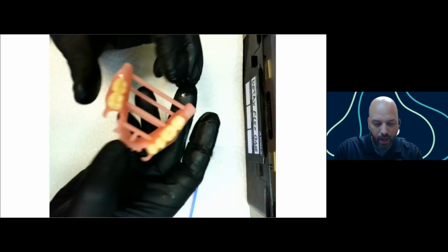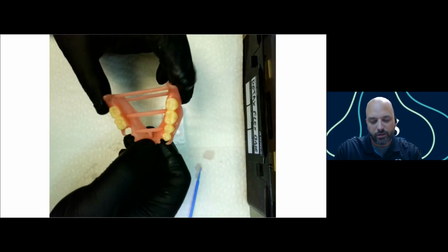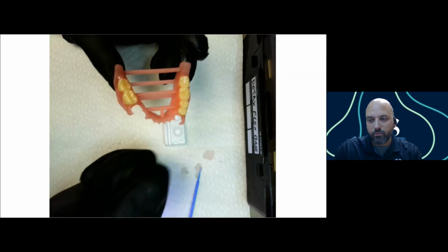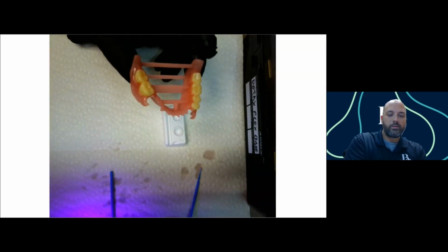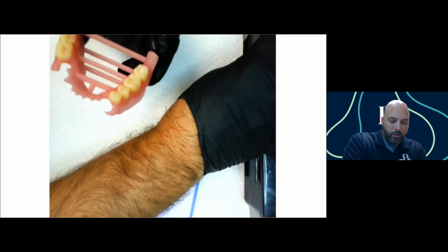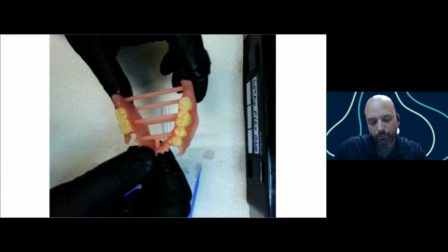All right. So now I'm ready to go put this in my cure box. I'm going to cure it for 2,000 flashes twice.